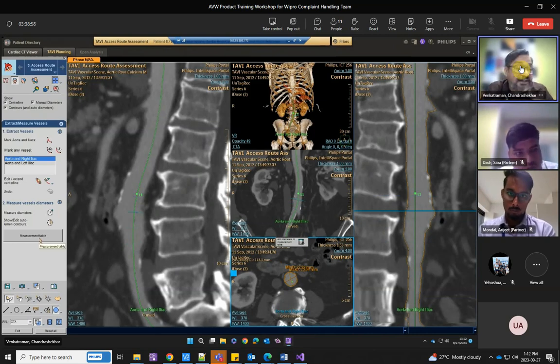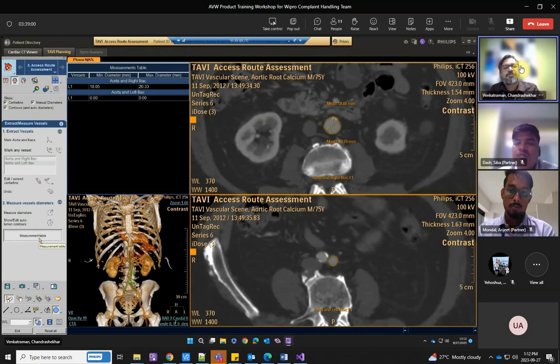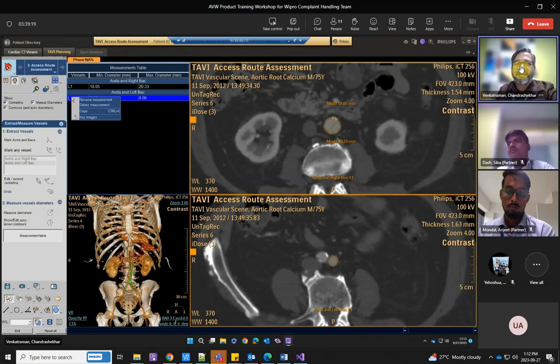So other than that, the next RFC which we did in this AVW15 is, you can see that this label is showing us the vessel name as L1 for both left and right side iliacs, correct? Aorta and right iliac and left iliac, both at L1. Why? Because this is an old feature and some may still prefer that, let it be the same name.